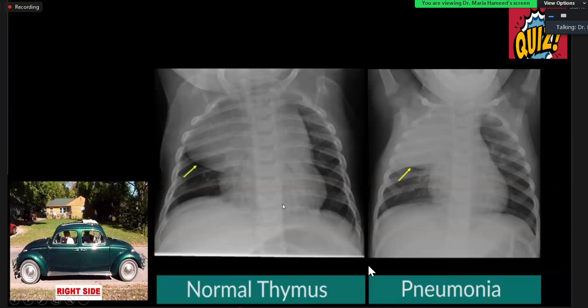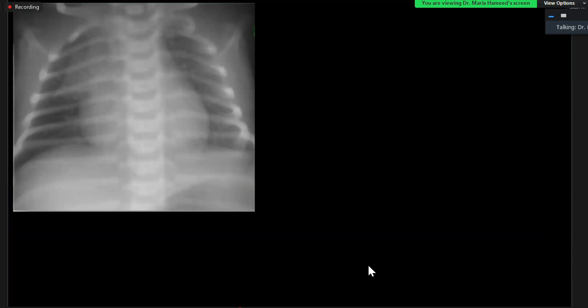So always remember, the thymus is a very fragile tissue. It is seen in a neonate in a full-blown stage, and after 2 years of age it is going to involute and shrink, and after 8 years you are not able to see it on the chest radiograph, rather on cross-sectional imaging. So let's see a few more phases of the thymus, because this is a normal physiological variant.